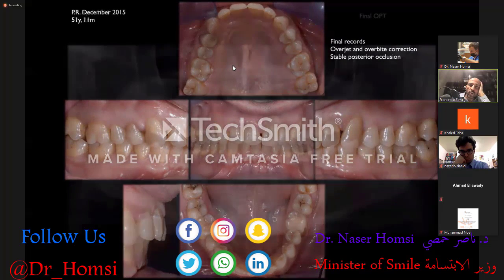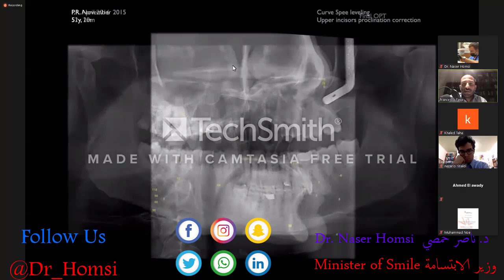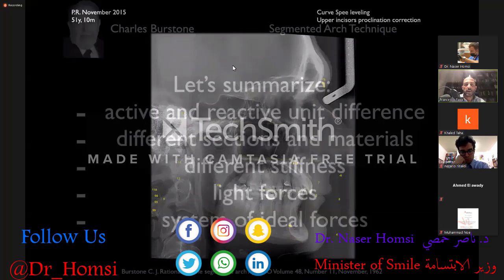I would like to show you the final OPT of the patient and final lateral cephalometrics with the good leveling of the lower curve of Spee and the correction of the flaring of the upper incisors.